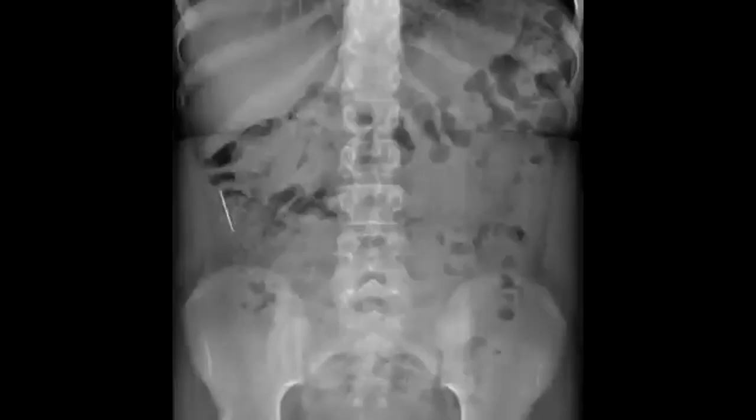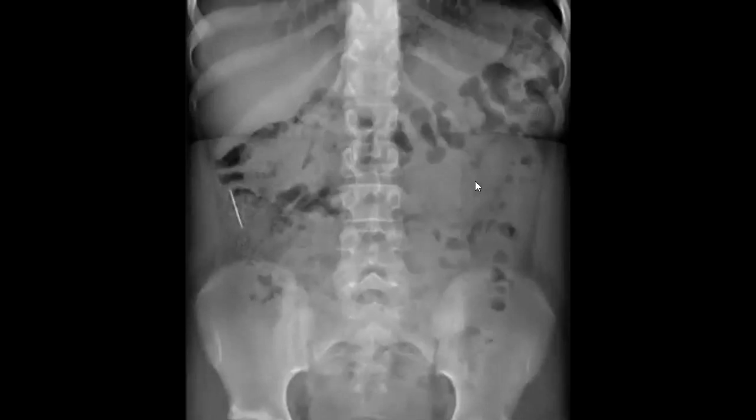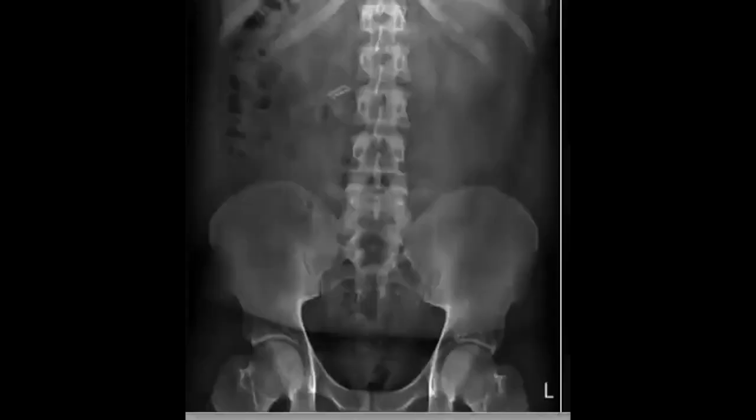This patient will be followed up by erect chest X-ray. Why? To check for perforation. So this patient will have many X-rays until this needle passes safely, with no perforation. So the fear here can be perforation. So what to do? He will do many abdominal X-rays or erect chest X-rays to check for any signs of perforation. Okay.